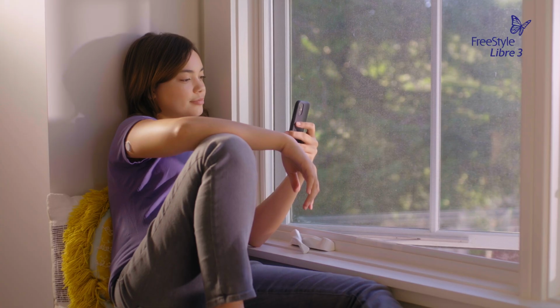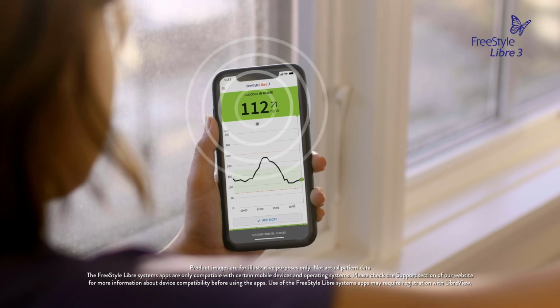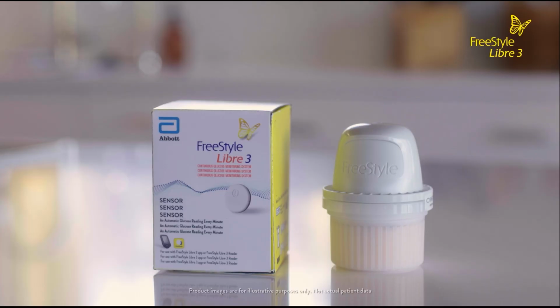It's great that Samantha can share her glucose information with her doctor from the safety and comfort of home. And her doctor can view her glucose trends and patterns to help her manage her diabetes remotely. The FreeStyle Libre 3 system makes it easy.